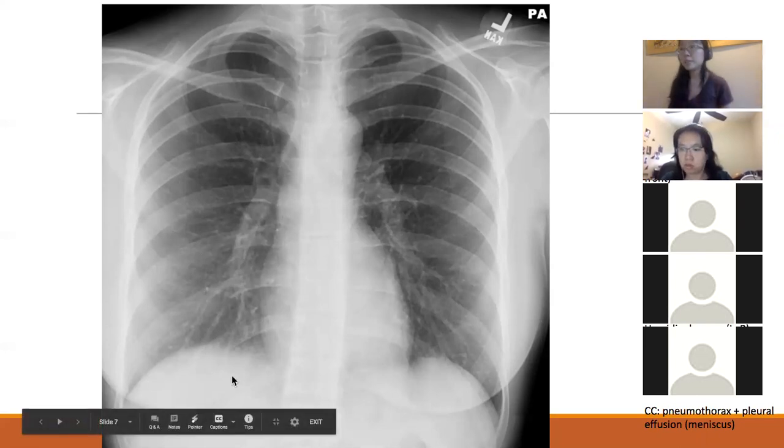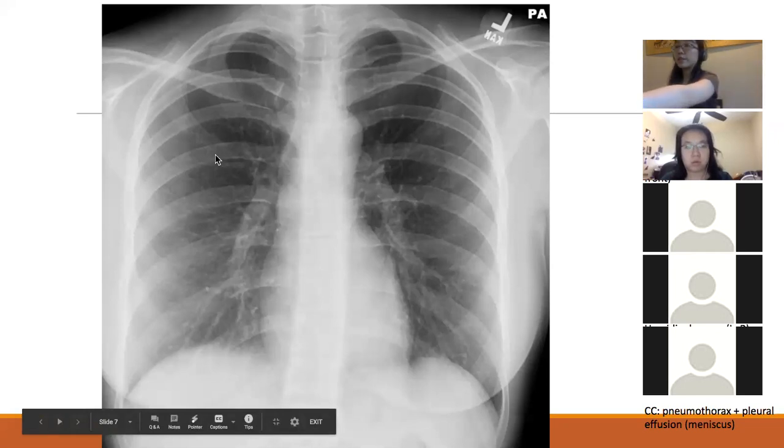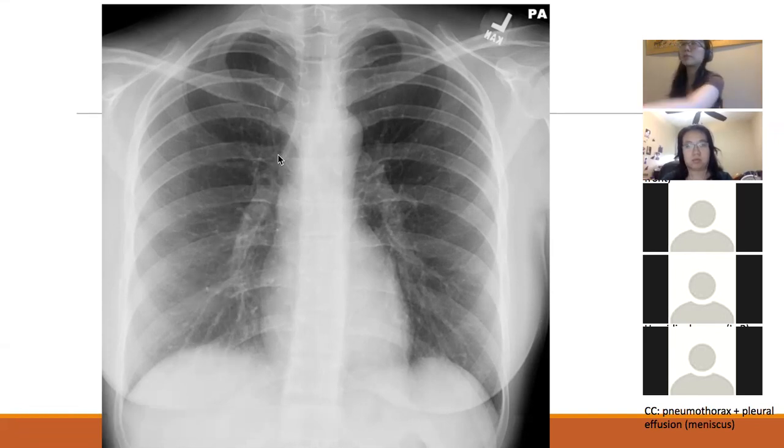And the spontaneous pneumothorax, those are generally in tall, thin men. Generally, it doesn't have to have a history of trauma. The lung is going to collapse inwards, which is going to result in less pressure, causing the diaphragm on the same side to move up and the mediastinum to move towards the pneumothorax. Okay, and I know that there are a lot of different clinical correlations, but those are most of the ones that you're going to be responsible for on this anatomy block.